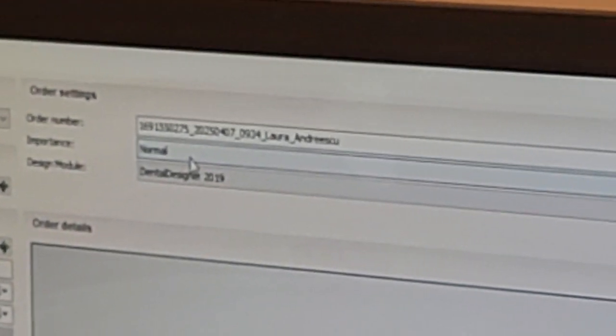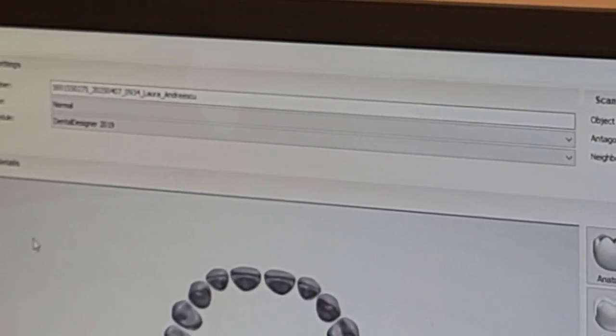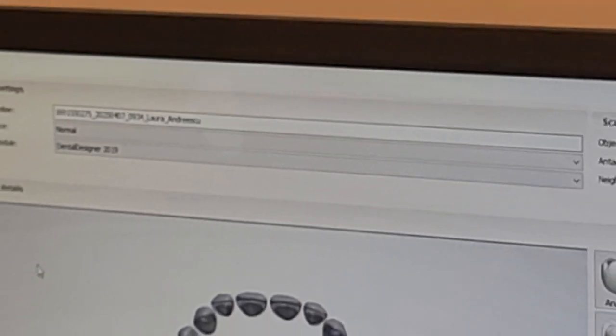Also make sure that here everything looks normal, so to speak. Let's say you did a case, and your custom abutments you sent out came back to you, and they fractured, or they have a little crack in it, or something's not right. Then you can go in here and change it to complaint, and once you change it to complaint, you can resend the order as a complaint, and you say, hey, it came out defective, so they can redo it without charging you, okay?